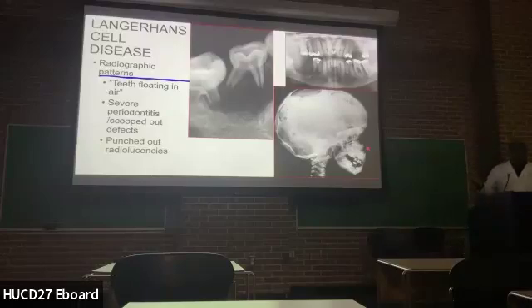Usually with a punched out pattern, the lesion is so aggressive that it's literally eating through the bone and it doesn't give the host enough time to react to it. In the case of a periosteal reaction, when you have this duplication, onion skinning, that's just one periosteal reaction, but it doesn't happen here. This is, along with multiple myeloma, a very, very aggressive malignancy.